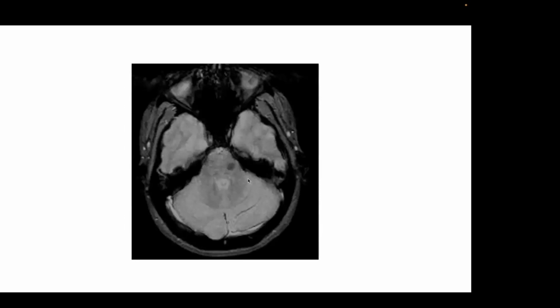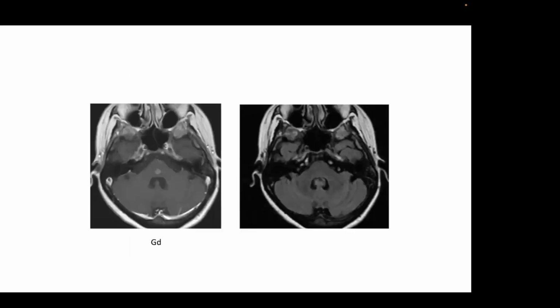And this is what I mean about them being visible on the SWI scan: the fact that you see it on the SWI scan does not automatically make the diagnosis of a cavernoma. So you can expect to see this on occasion with capillary telangiectasias. I've also seen this with patients who have been followed for a long period of time, where all of a sudden the old scans don't have SWI imaging available. Now you do, and you see it on the SWI, and people will misinterpret that to mean that they hemorrhaged in the interval. So again, this is an expected finding with capillary telangiectasia.